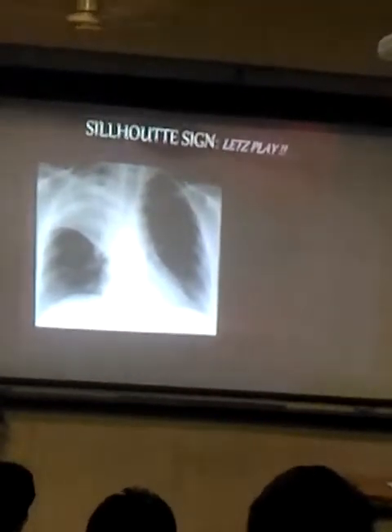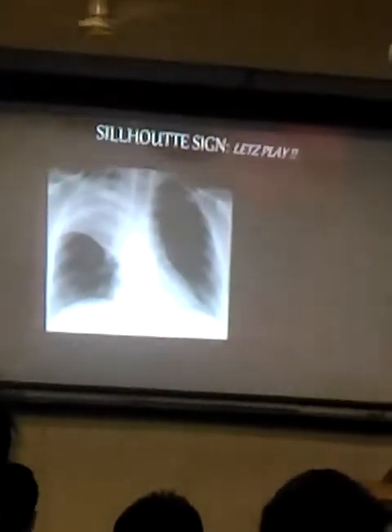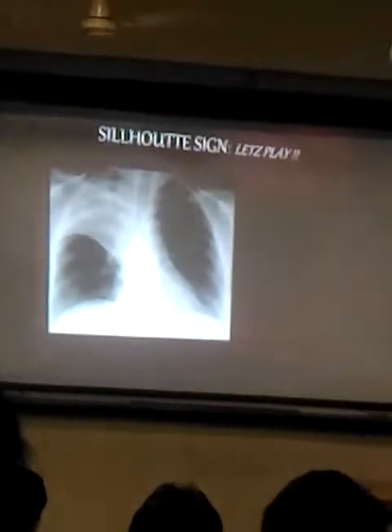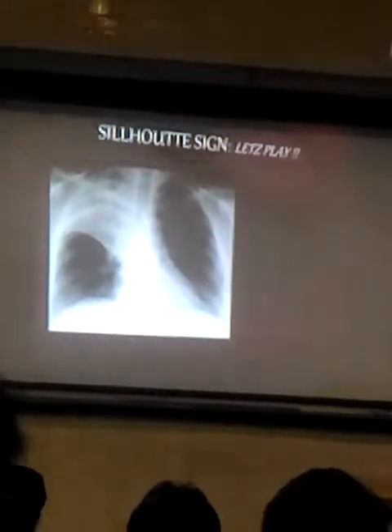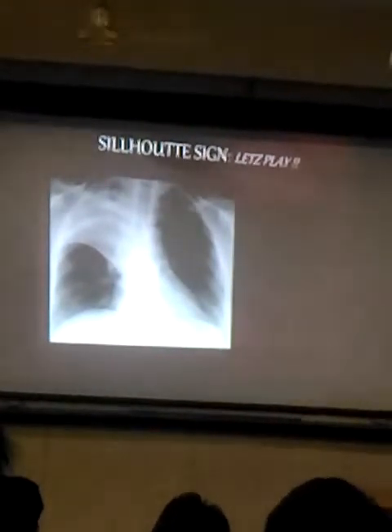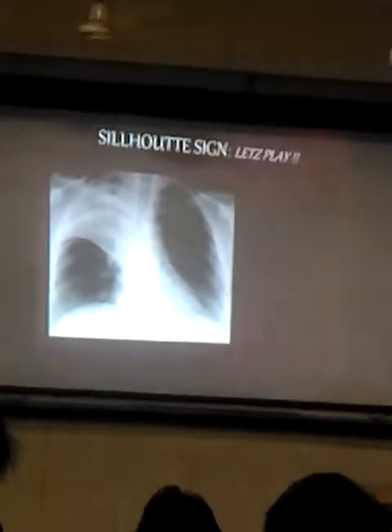And this sharp inferior margin, remember, is a very consistent feature of right upper lobar disease. Why does right upper lobar disease have a very sharp inferior margin? Because there is the presence of a normally located fissure here. What is that fissure? The horizontal fissure, which limits the spread of infection from the right upper lobe to the adjacent segments, and this horizontal fissure is what gives rise to this very sharp inferior margin. This is a very characteristic feature of right upper lobar disease.